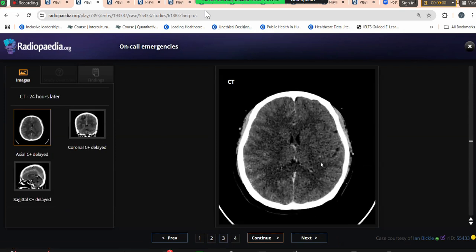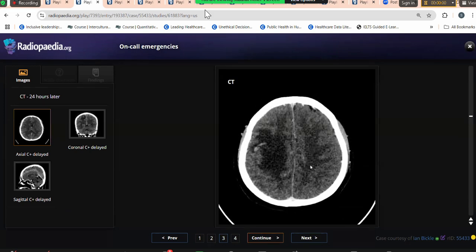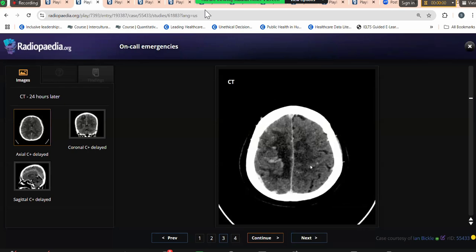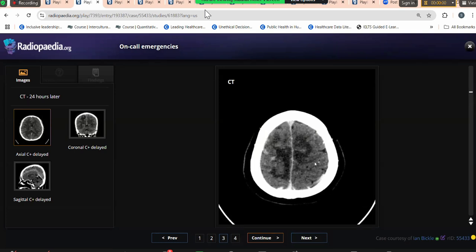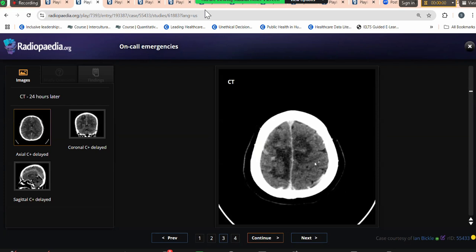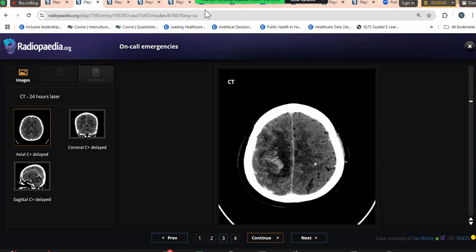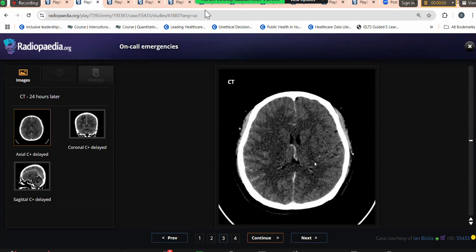Yeah. Now, immediately what you should see here is that this is post contrast. And the other thing which I wanted you to see, that this is a young patient, right? There should not be any white matter ischemia. But if you see now, there is interval development on the left side as well of the hypodensity. So this was actually supporting what you were saying all along, that now 24 hours later, there is an area of hypodensity in the left cerebral hemisphere as well. So there is bilateral infarcts now, which makes me more suspicious that these are venous infarcts.